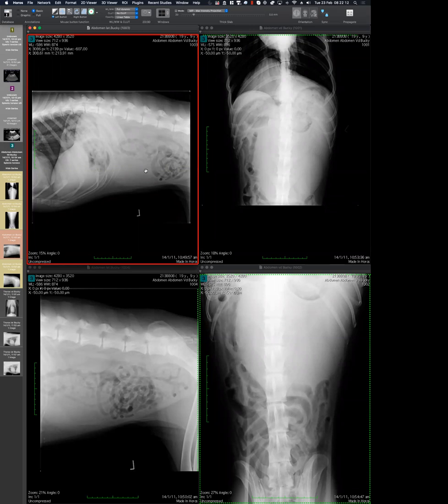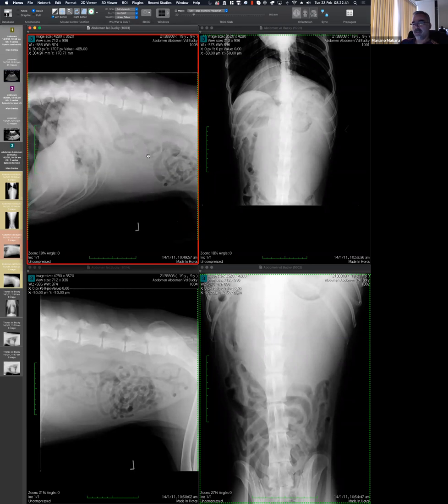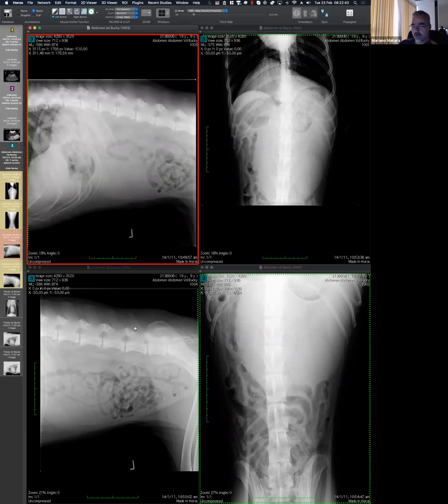Personally, the dog looks really lean, so you're going to get poor serosal detail anyway. And you can kind of see the ventral border of the mass on that left lateral. So I'm not strongly convinced there's fluid there myself. But every week I get serosal detail wrong, so who knows? I think I agree with you. I'm pretty sure there is no fluid there.